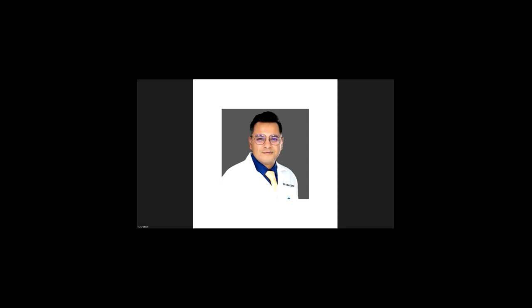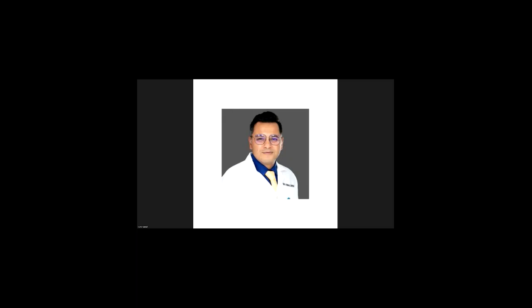Supratentorial hemorrhage. In the scan, where do we have to look for this? What you're talking about more is cortical hemorrhages, which are seen in relation to the perforating arteries. And they are usually seen with neonatal stroke, neonatal arterial ischemia, when you have congenital heart disease or HIE. More with congenital heart disease than with HIE.